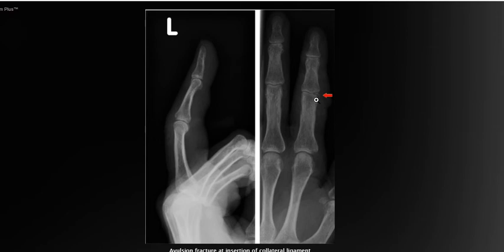so we're going to need to think about what kind of injury this may have been caused by. A few to think of are catching the finger in bag handles, doors, also catching objects, falling onto the hands and fingers, and laterally moving the finger bones side to side. You can also see a significant amount of soft tissue swelling here on the medial side.